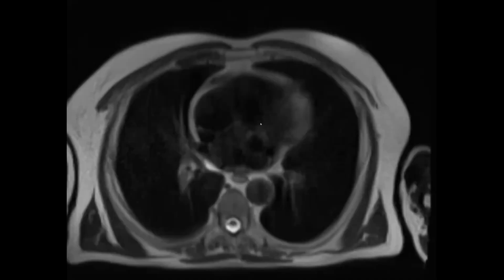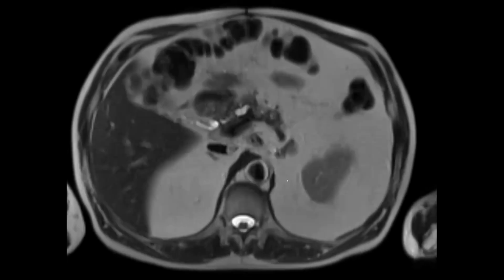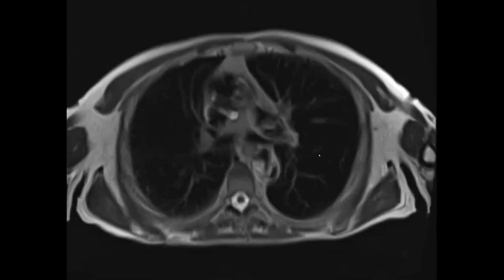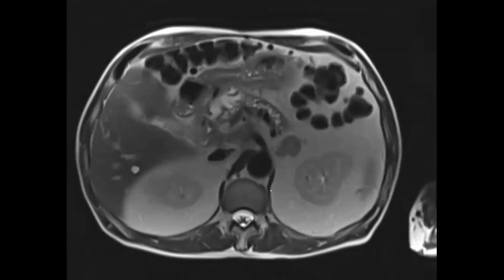Okay, so they went to try to resect this main duct IPMN, and they had to abort the Whipple because there was so much pancreatitis and inflammation that they could not peel it off of the SMV. So they ended up aborting the Whipple and decided to just monitor the patient. And then a few years later, the patient came back, and this is what it looks like now.